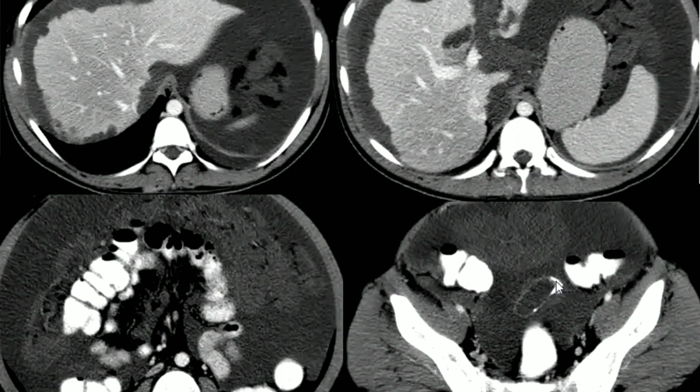Also, in the pelvis, you can see a blind-ended tubular structure with possible foci of calcifications. If we have pre-contrast images, it will be clearer. A blind-ended structure means we are dealing with the appendix. The normal diameter of the appendix is 6 millimeters. However, here it is significantly dilated, which means mucocele of the appendix. The presence of calcifications and the background of pseudomyxoma peritonei raise the possibility of a mucinous tumor of the appendix, which is the most common cause of pseudomyxoma peritonei.